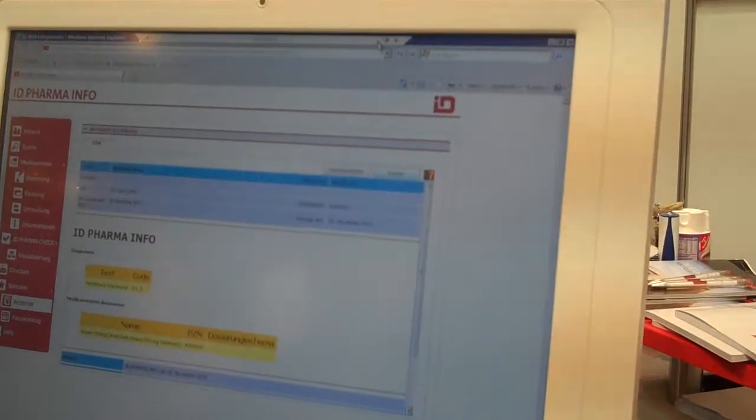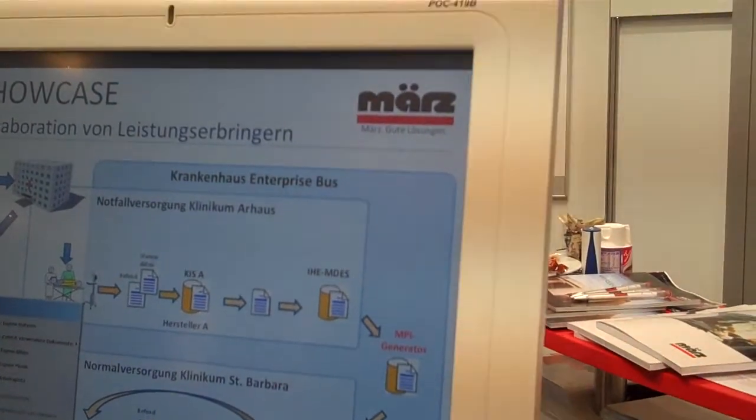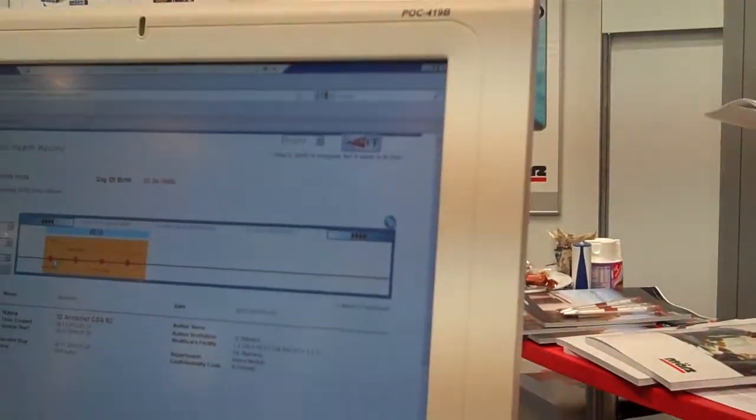Now we go back to the electronic health record to do a search and make sure that it is now populated. We have to repopulate the document list. Now you come down here, and you can see that the medication administration record summary is published in CDA format, available across the exchange. So in total, what we've seen here is a patient traverse multiple institutions and have access across the multiple institutions to all the care documents and medical data.